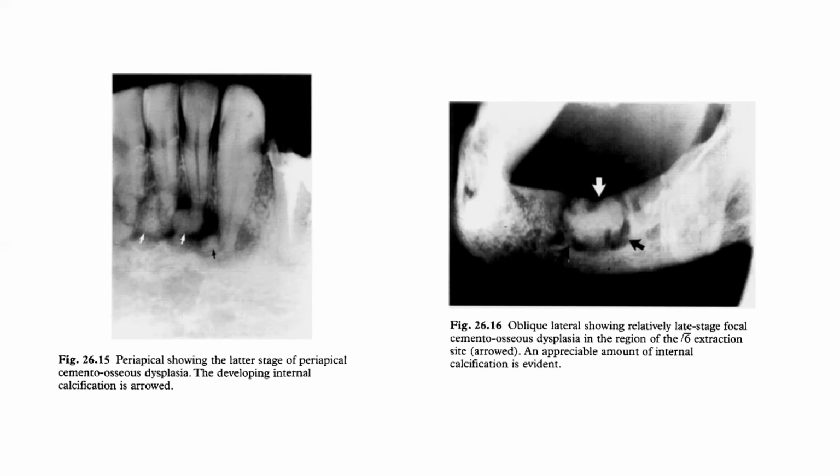Small, usually up to 5 to 6 millimeters in diameter is their size. They're round and monolocular, and they often appear on more teeth, so it's basically a multiple osseous dysplasia.